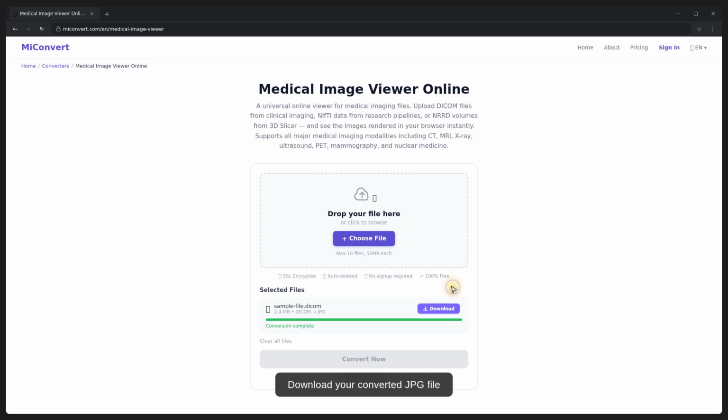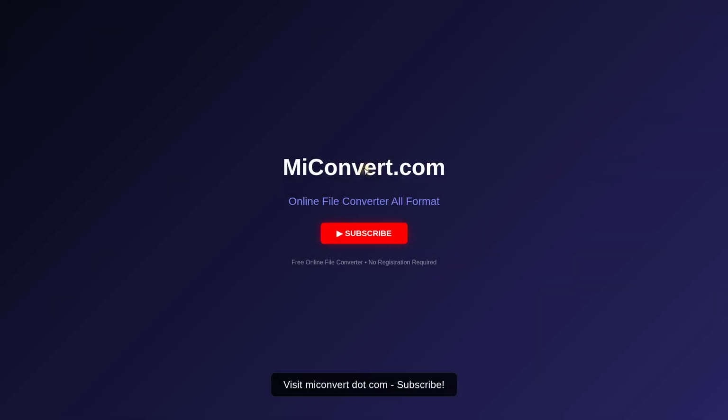Click Download to save the JPG file to your computer. That's it.